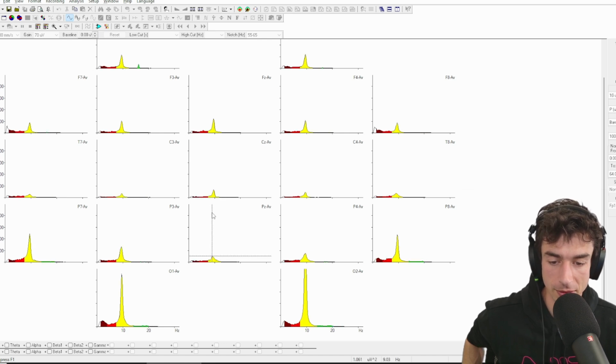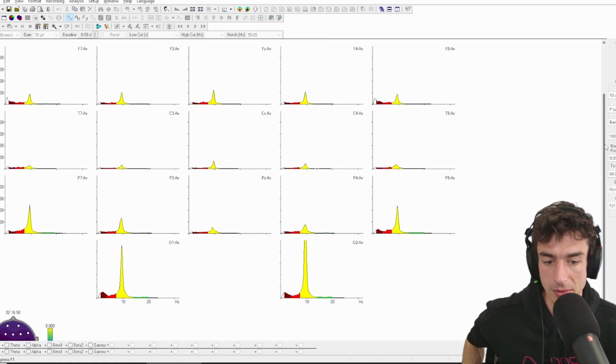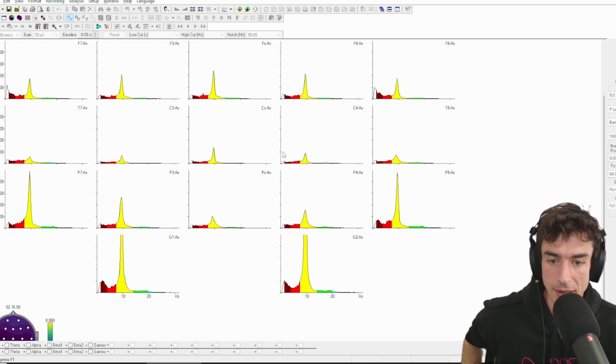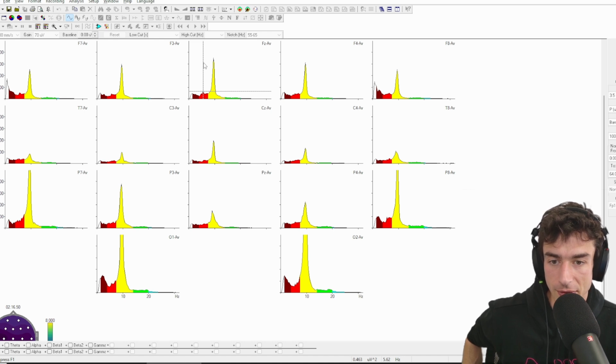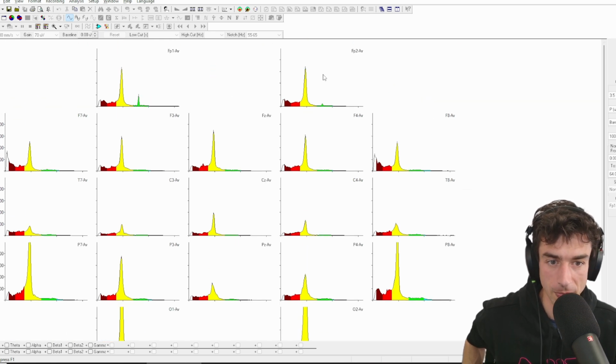I'm going to pick the peak from PZ, this highest peak here, which is at 9 hertz, which is on the slower side for an individual in their early 20s. And it is biased to the right occipital area in terms of highest amplitude. And then the question is, what else can we pick out here that's relevant, given that there isn't that much else that's standing out? We did see the frontal theta show up occasionally.